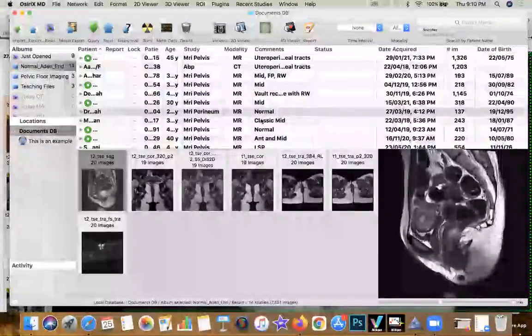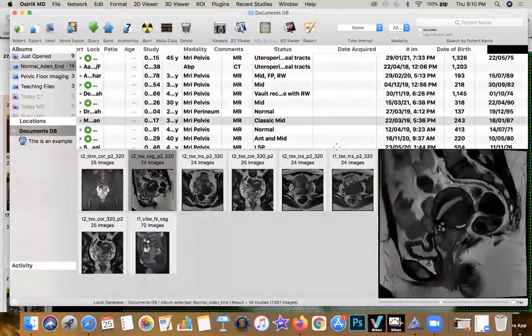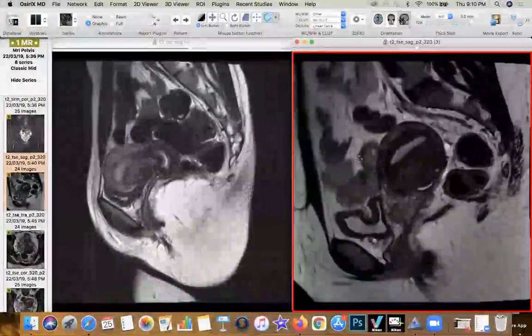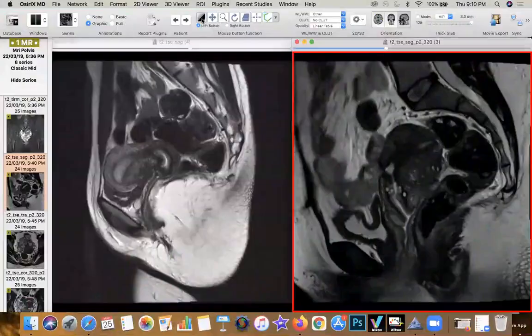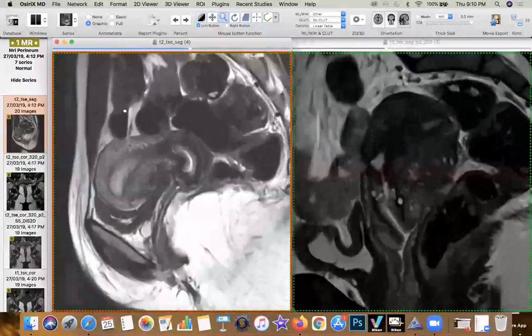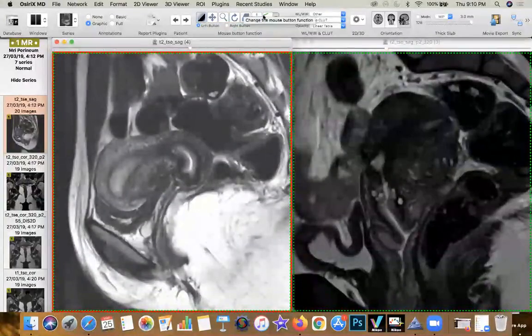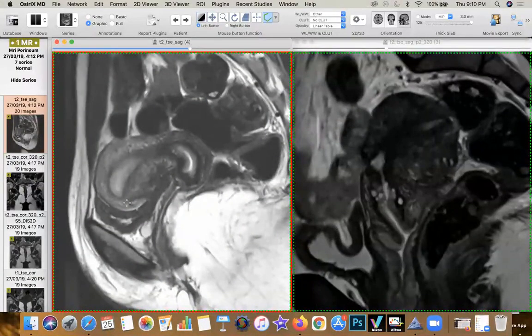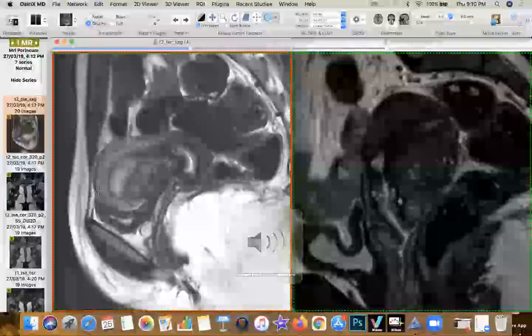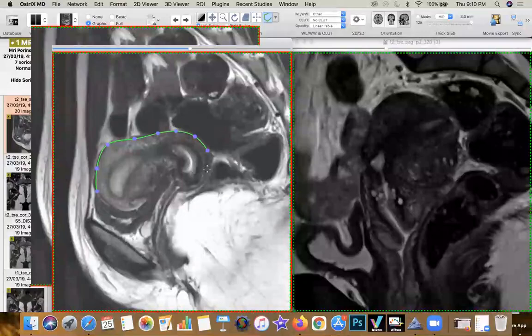Okay, so I'm going to start off with the first case just to make you guys understand normal contouring. Have a look at this. So look at this. This is a normal contouring. I'm going to draw it all over again. Look at that smooth C, which is kind of forming off.